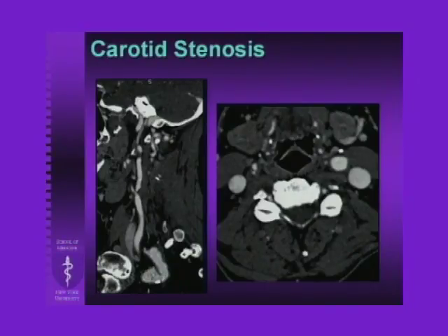Carotid stenosis, again, look at the source images. Here's the MIP. Here's the source image. You actually see the vessel walls a little thickened here. Here's the plaque with some fatty components in it. It just confirms what you're looking at.